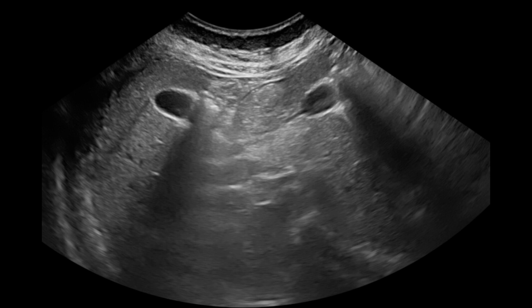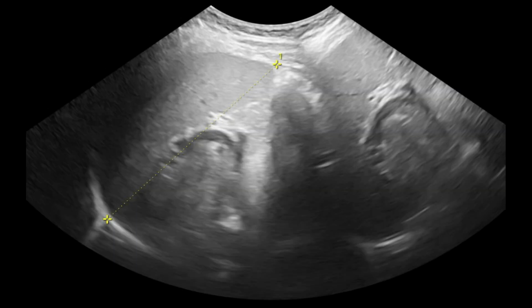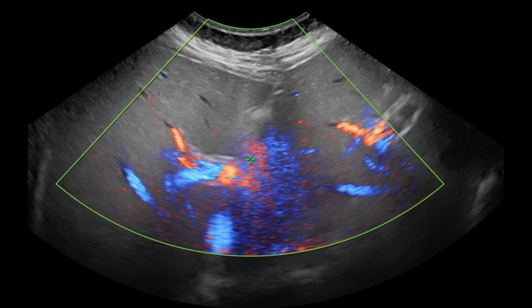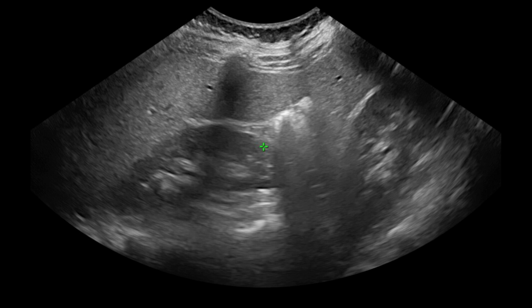I've gone through some of the articles having such incidents. Many articles talk about the common artifacts, such as beam width artifact, mirror image artifact or double image artifacts, which sometimes might mislead the diagnosis. To top it, one article described even a transvaginal study where a mirror image artifact in early intrauterine pregnancy was interpreted as an ectopic pregnancy with one intrauterine pregnancy. But in our quiz, the mirror image or double images or duplication artifacts are seen everywhere. So I concluded that these are not those artifacts.